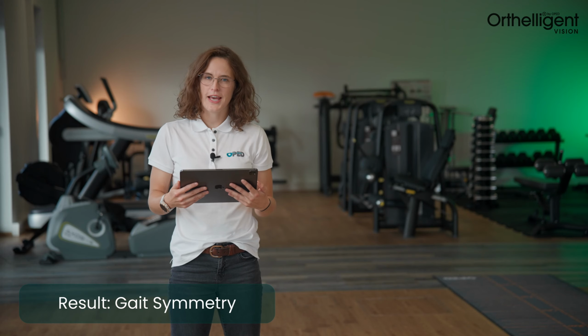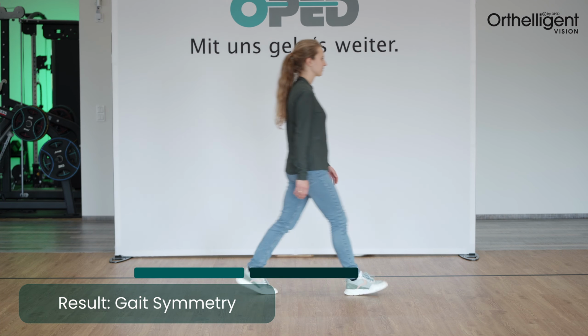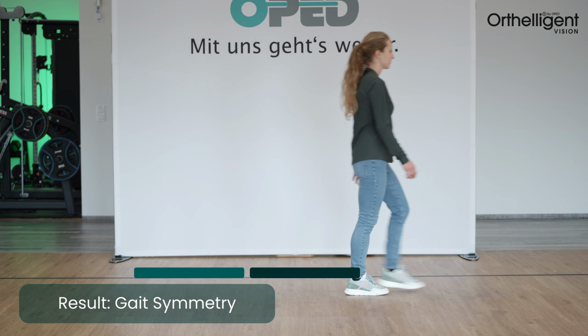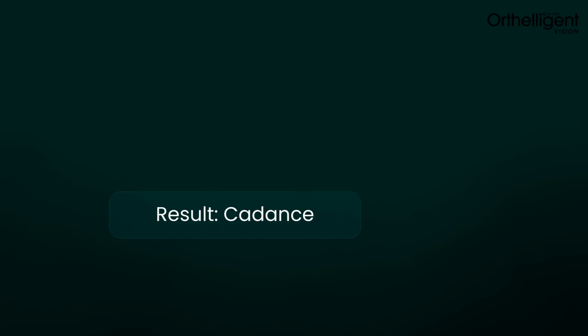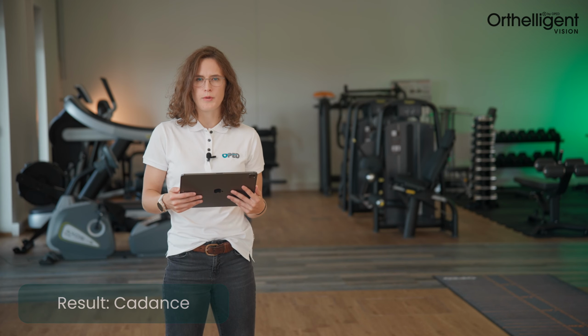The parameter of the gait symmetry compares the step length of the left and the right foot. A value of 100% indicates that your step lengths are equal. The parameter gait speed is the velocity of the patient while he's walking. The parameter cadence describes the number of steps per minute.